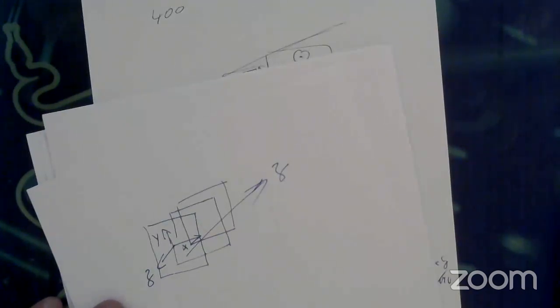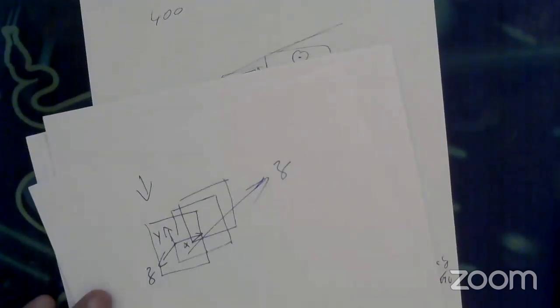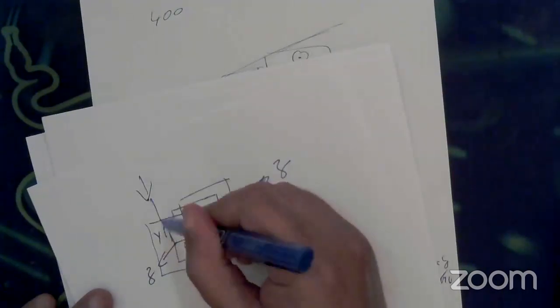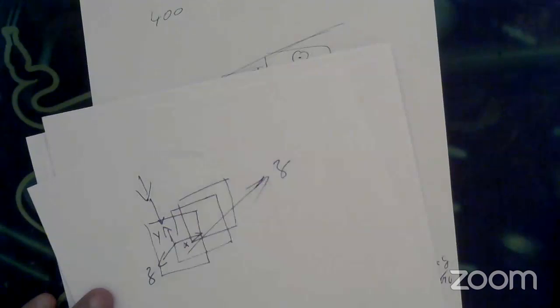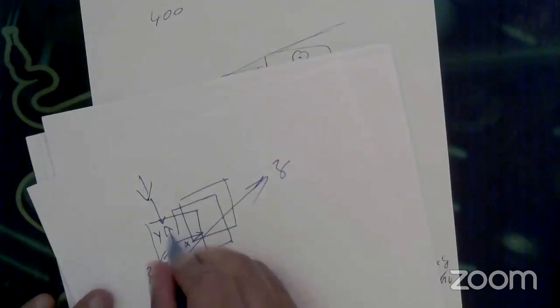Okay. Clear? Yeah. This is Eclipse, right? Yes. So now I actually want a field. Suppose I want the field to come anterior from there, okay, from that direction. That field, okay, this is my field. The field needs to be parallel to the Y. Yes. Make sense? Yeah, makes sense. Okay. And if Y is in that direction, the field is actually opposite to the Y. It's in the minus Y direction, right? Yeah. Opposite direction, right? Exactly. Yes. Okay. So now the problem I have is that those X, Y, Z, this is Eclipse.